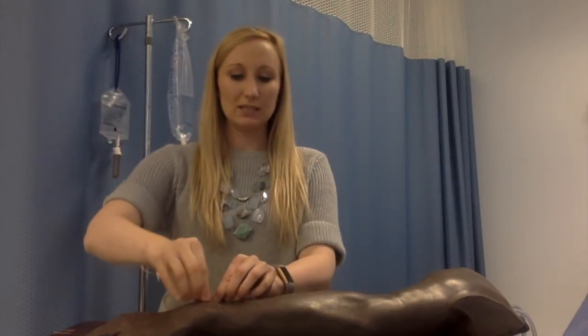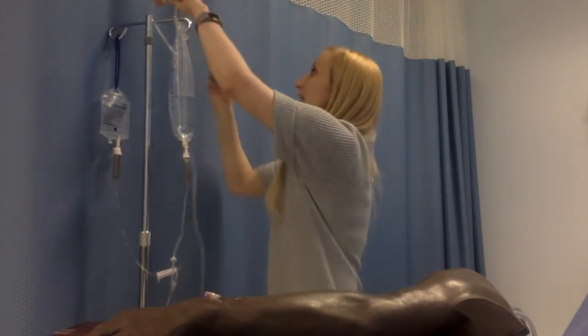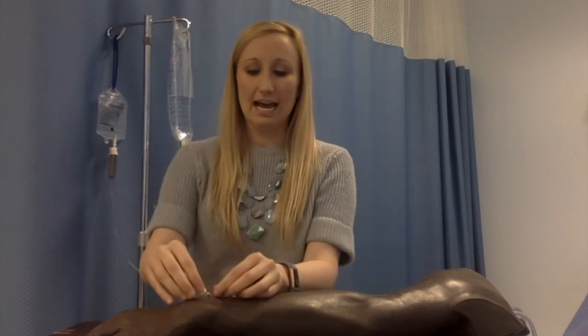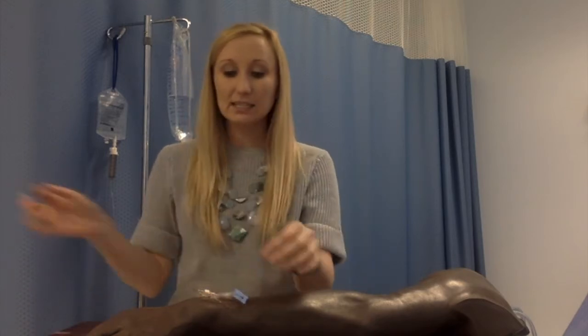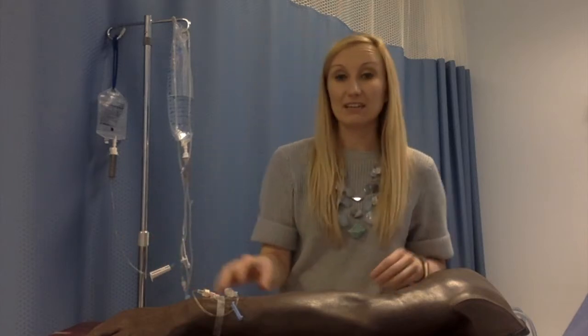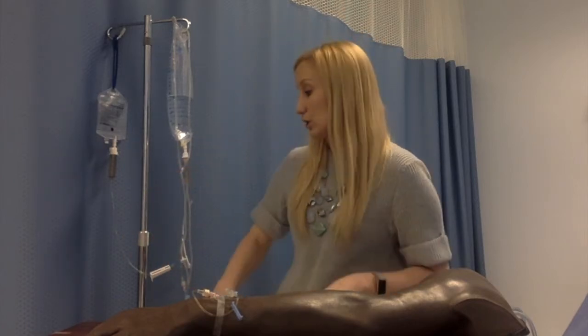The third tubing system is your heparin lock, and it would be used in a situation if you had a patient that didn't need continuous fluids, but you still needed them to have IV access. You would give them or allow them to have a heparin lock. So you would just connect it. It's a much smaller tubing. You would just connect it to the site and tape it down. And now you have access to the patient if you need it for whatever reason, to give medications through or to hook the patient back up to a primary tubing or a piggyback solution.